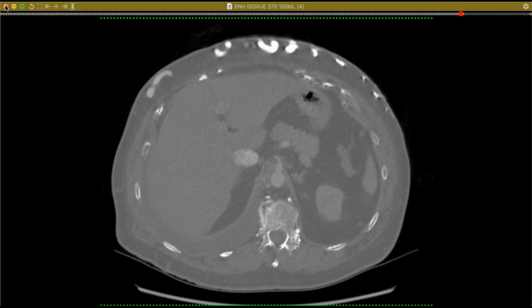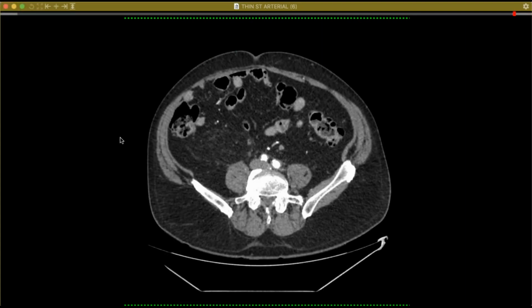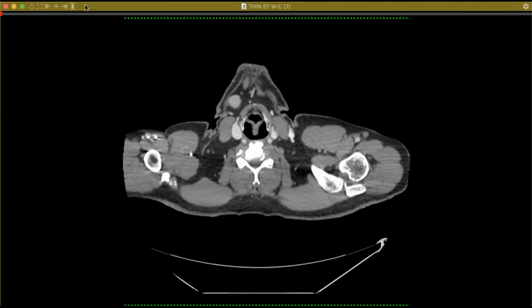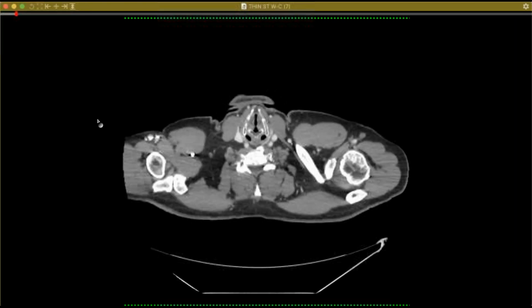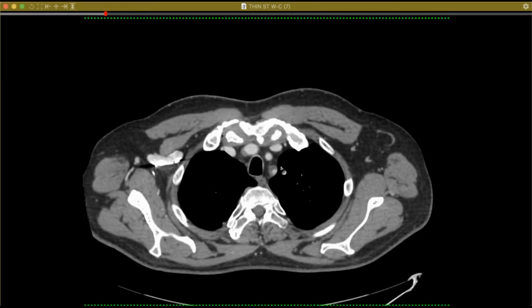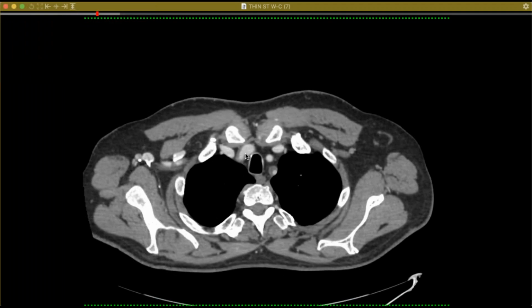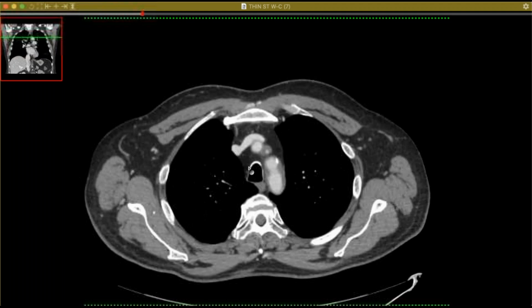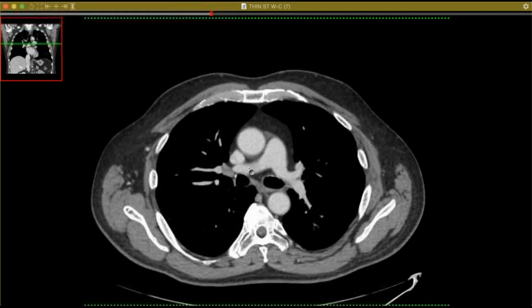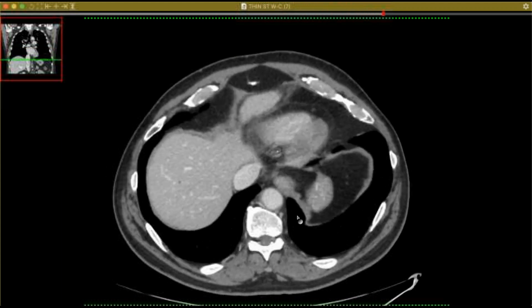All right, well, since you showed some, let's see, I have a little time here. So I may have shown this case a while ago, but I actually have a diagnosis now. So this is a 60-year-old male who has a history of renal cell and is on a TNF alpha inhibitor. I think it was renal cell, I don't remember, but I noticed this thickening along the subclavian artery there, and then there's even a little bit in the right brachiocephalic artery, and then a little bit of aortic thickening, and then if you go down, you can see down in here that was all new.